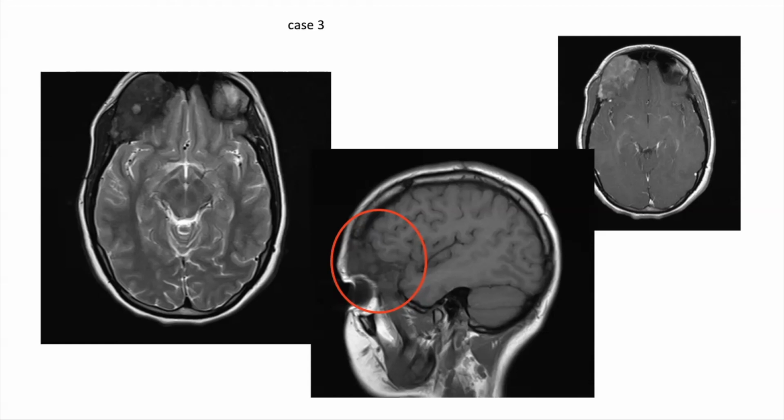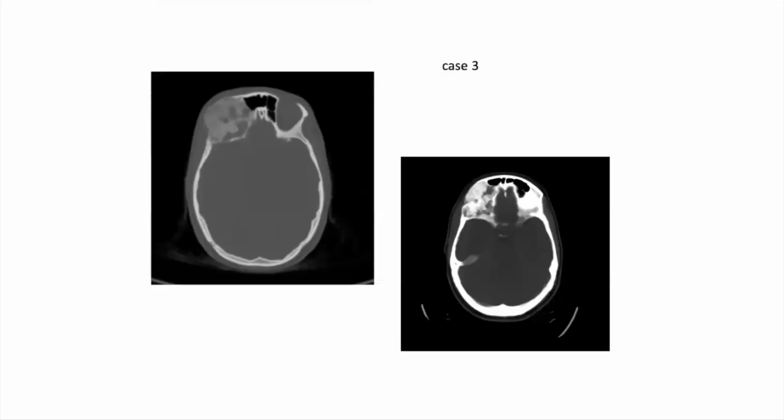There are going to be cases where maybe you're not sure. But again, in terms of frequency of occurrence, fibrous dysplasia is much more common than intraosseous meningioma. It's frequently seen in younger patients, and I think those features may help you in making the distinction. But again, intraosseous meningioma usually should be sclerotic, will grow over time, and may have some more aggressive features on the bone imaging. Fibrous dysplasia is usually complex, enhances more than does the intraosseous meningioma, and has, if you look at it here, more ground glass appearance.